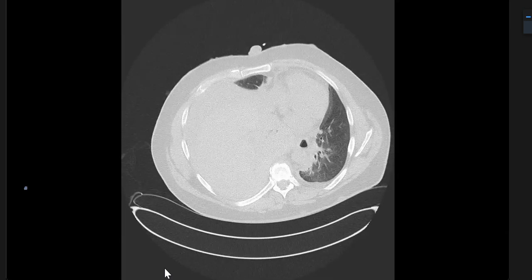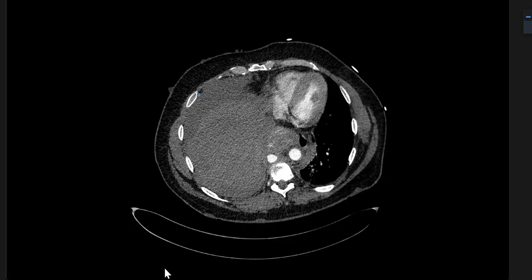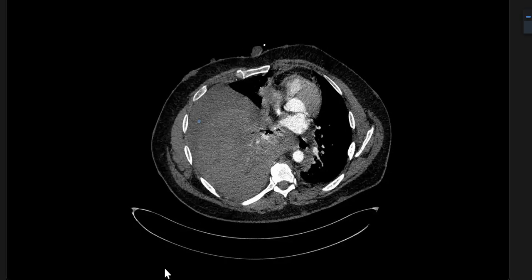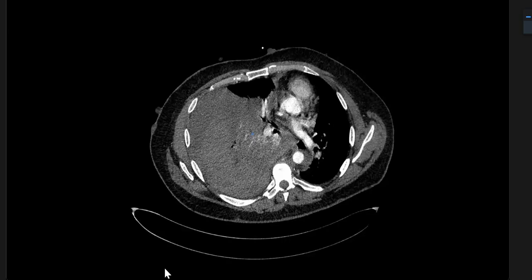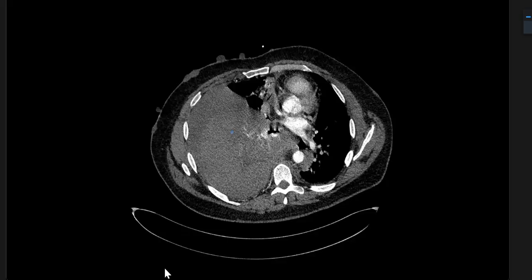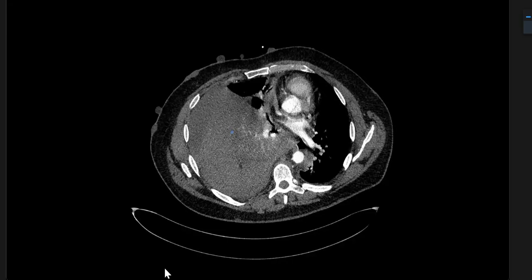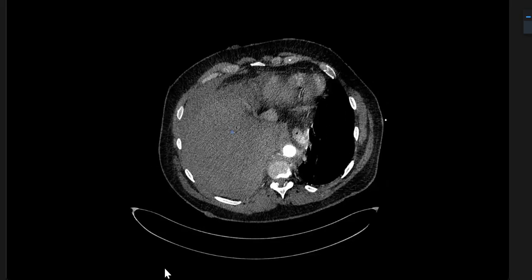I would like to see in the contrast phase, post-contrast phase. You get the post-contrast phase. This is the money. This is where the money is. Okay, here again, can you see? You just ignored those hyper attenuation within the contrast. Within the pleural effusion, there are streaks of hyperdensity, as if somebody is spurting the contrast in the pleural cavity. That's why you are getting different shades of gray here.